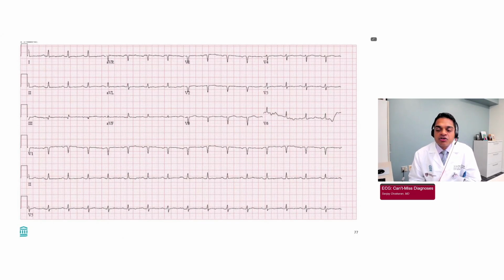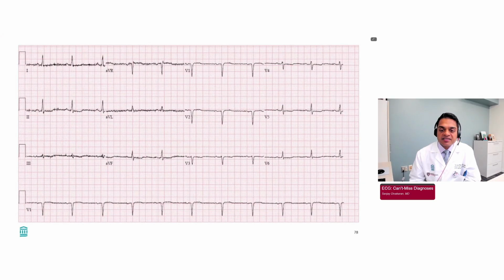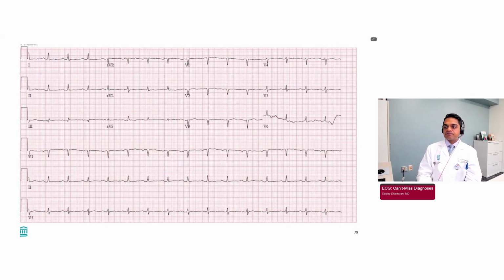So this is the patient's current tracing. I'm going to show you an ECG at baseline for her. And I'm going to show you the current tracing again.